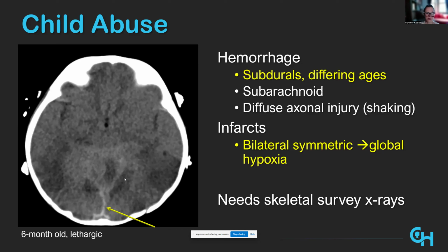It may be as a result of a respiratory arrest. Or it may be as a result of intracranial mass effect. If there's swelling of the brain, that can occlude the incoming blood flow. So very concerning when you see hypoattenuation bilaterally.